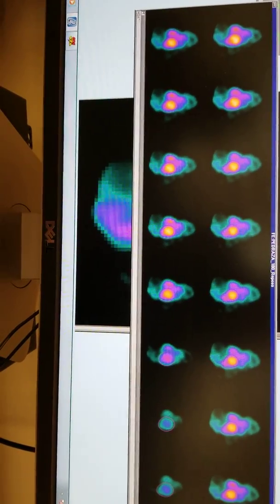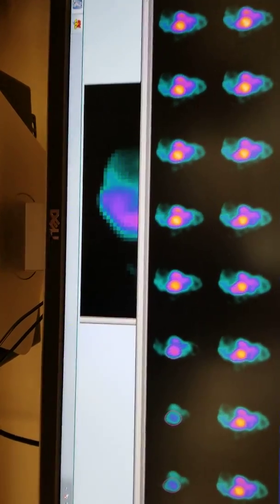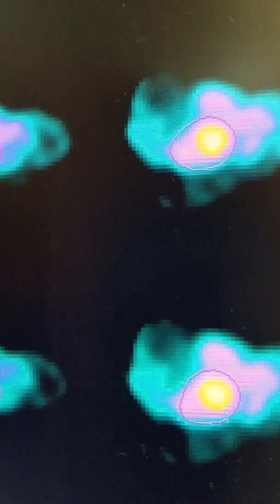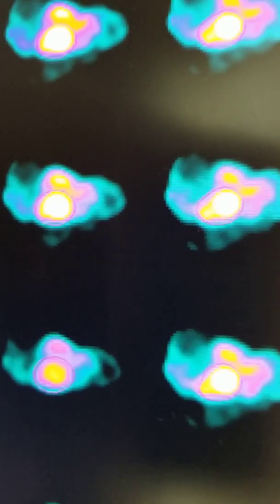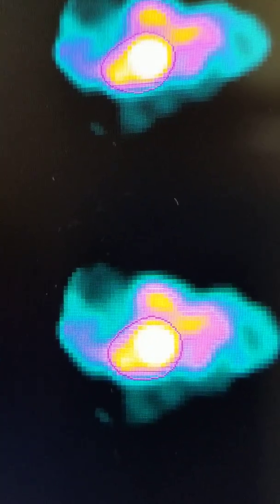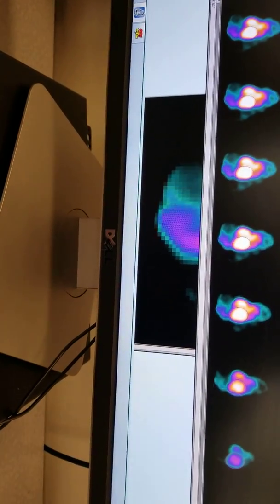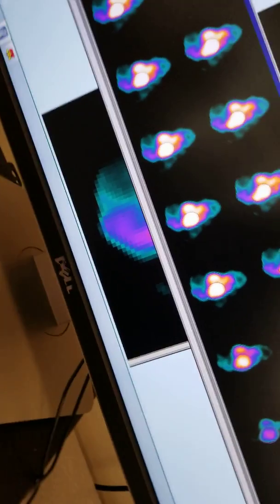So adjust your brightness again. If you've drawn this and you're like, oh my Jesus, if you check that out, those circles don't fit that very well. It's not very pretty, right? Adjust your brightness, make it brighter, and it'll fill out some of those boxes. You can't adjust and delete your septa. You have to still have a clear septa. So don't make it too bright, but you can brighten it up, make it look a little bit better.